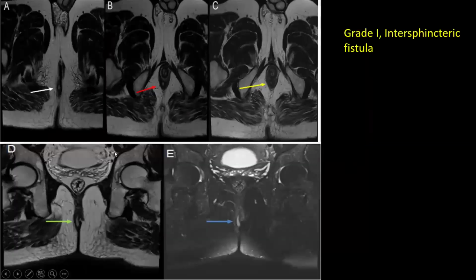Right. Again, now a simple case of intersphincteric fistula. Here you can see the fistula, external opening 6 o'clock, going, and just opening, right? So simple linear tract, small tract with both openings, external and internal, at 6 o'clock.